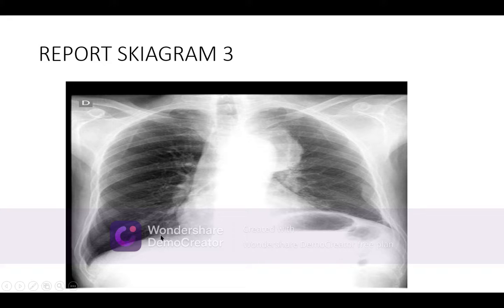After the middle, the dome of the diaphragm is flat here. Flat, it is not curved. There is something, pressure is going on, because in the superior mediastinum there is a mass, and the anterior mediastinum, probably due to this pressure, it is a possibility. The costophrenic angle and cardiophrenic angle are normal, but the proportion of the right and the left is reversed.